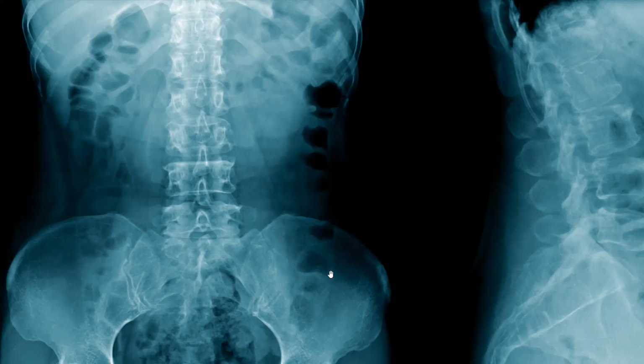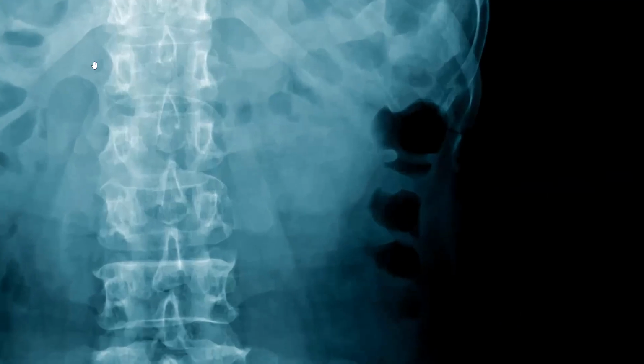The reason we can see that is because there's fat on the outer margin of the bowel wall here and air in the lumen. Okay. So if you window the X-ray down to detect differences between soft tissue attenuation and fat, you'll be able to visualize the bowel wall. If I zoom in a bit more here, find another example.